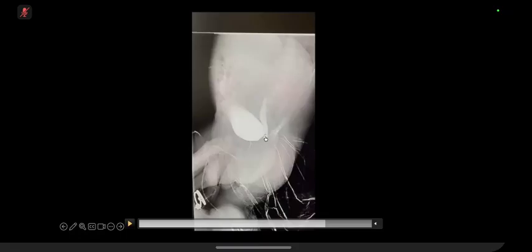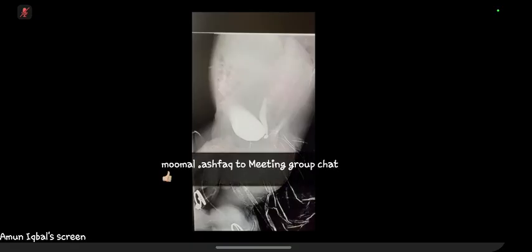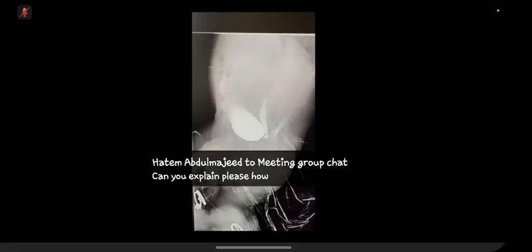Okay, so here is the diverticulum. About this case, the importance of including it is that sometimes vesicoureteric reflux is part of the examination. What I want you to do is try to grade it, because in routine practice, when you are reporting these kinds of films, the primary physician always wants you to grade these. Candidate one, can you grade it for me?